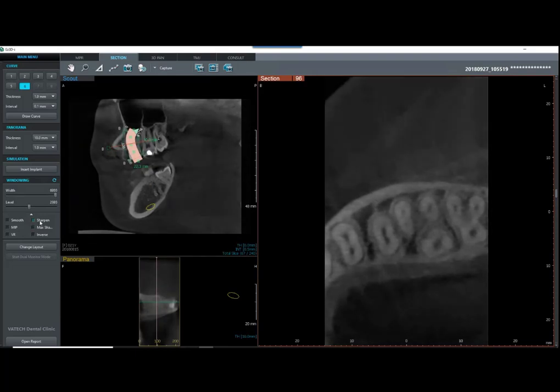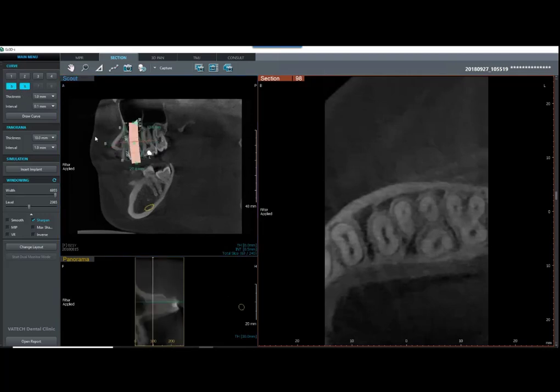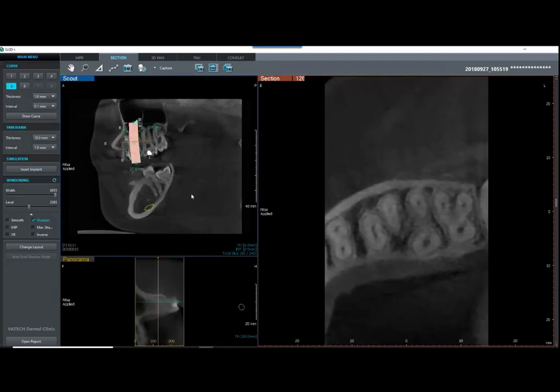I'm going to darken that up a bit and maybe use my sharpening tool and see if that will highlight that canal a little bit better. So right now, what I'm seeing is canal, canal, canal, and canal there. Let's click on escape, and we can scroll down inferior or scroll back through superior. So take a note over here, first curve all the way through our 6th curve, that we've drawn different ways to draw the canal through there.